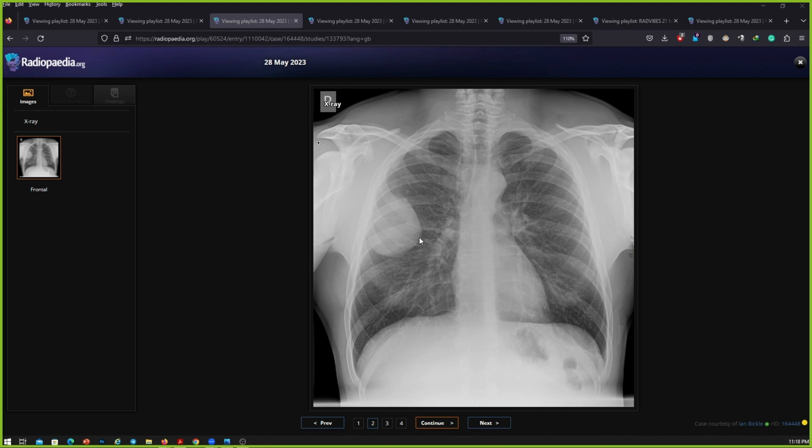So what Radiopaedia says is that in this sign you will have a well-defined inner border, which we can clearly appreciate over here, and the outer border will be very ill-defined. The reason for this is that in the X-ray, the beam is tangential to this part of the lesion. So the contrast of the lesion with the underlying lung is very clear in this part. Whereas on the lateral part, on the outer part, the beam is not very tangential, not at the correct angle. So what happens is the lateral half of the lesion merges with the pleura or the chest wall, and the border is obscured, as we can clearly see in this part. So you can very well appreciate that the medial border is very well defined, very sharp, whereas when we go laterally, it is very ill defined, it is very hazy.